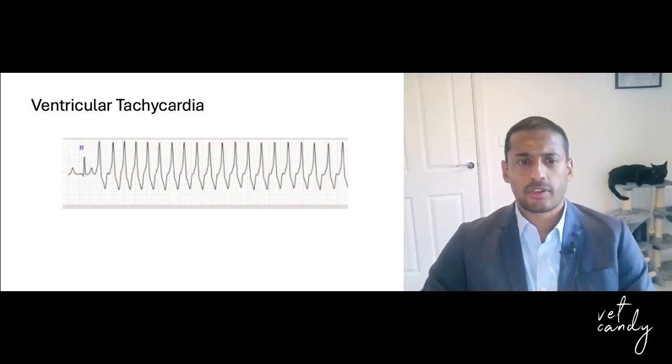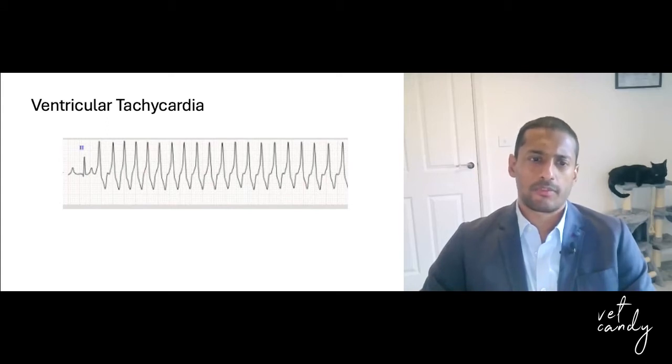When trying to identify ventricular beats, it definitely helps to have normal sinus beats to compare them to. Often with fast ventricular tachycardia, you won't be able to see P waves as they get lost in the larger electrical signals caused by ventricular depolarization. Remember, the cardiac conduction is not uniform, so there may be P waves, but they are not associated with the ventricular beats.